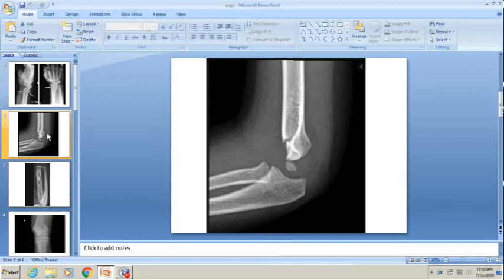Number one, you can see the fracture clearly. What are the signs you can extract from this X-ray? Someone had written earlier, fat pad sign. Yes, you can see the fat pad sign. What else you can see? Unusual posterior prominence of the point.